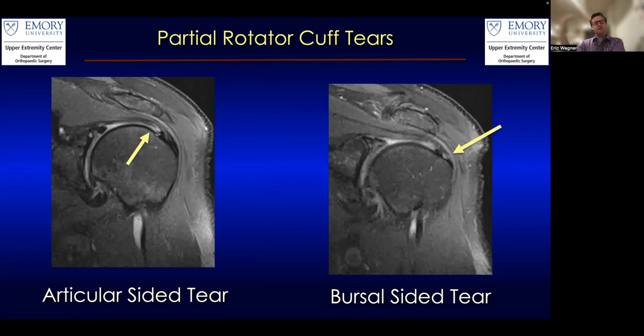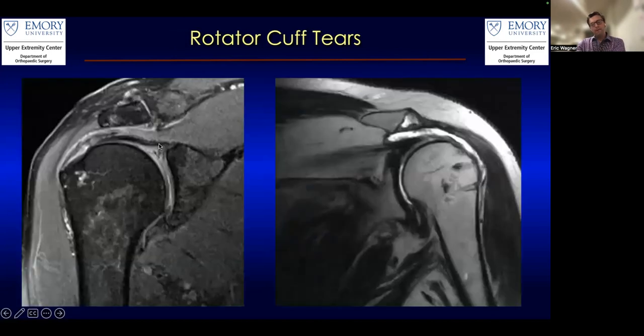Occasionally it causes pain. Occasionally, we have to intervene. Vast majority of the time, not. Vast majority of the time, you can treat with injection therapy. Don't have to do a whole lot, but you can see the bursal sided and the articular side here.